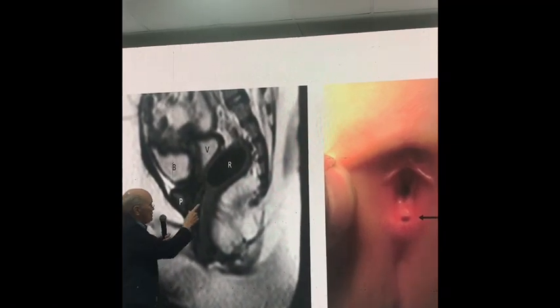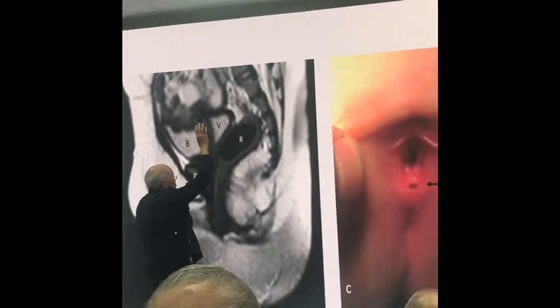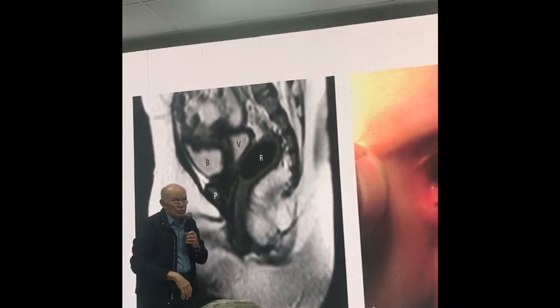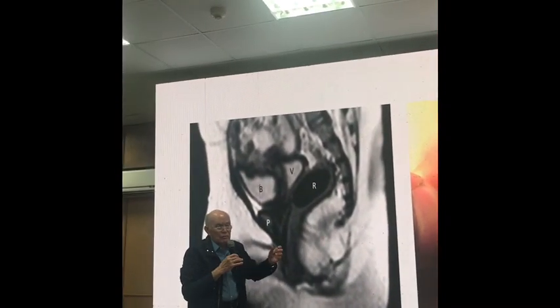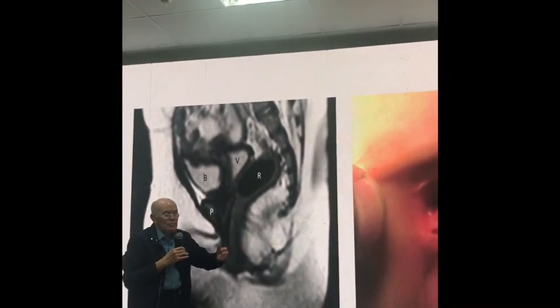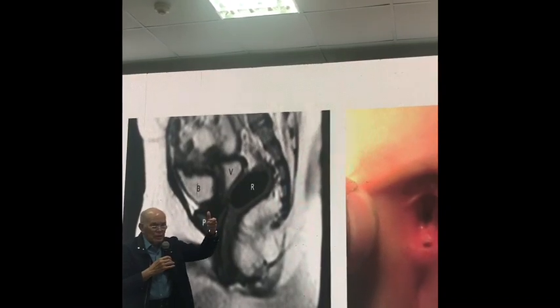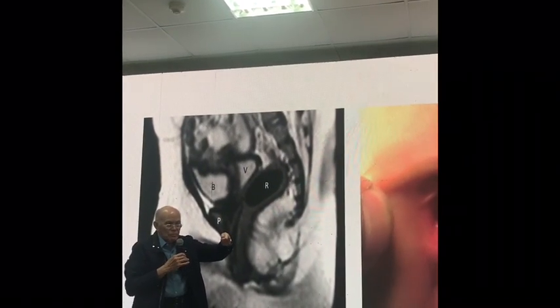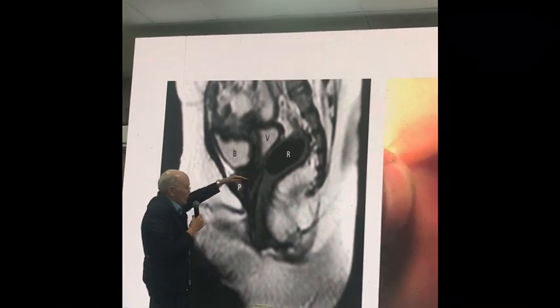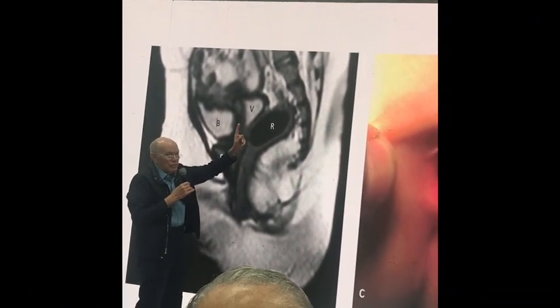In this case, according to this, the rectum is very high, the vagina is there, and the common channel is very long. That's false. Unless you have a distal colostogram and an endoscopic study, you cannot say that. And the same in the male patient: when you just put contrast material by gravity in the distal colostogram, the contrast material always stops at the PC line, always. And the radiologist will tell you that the patient has a high malformation.